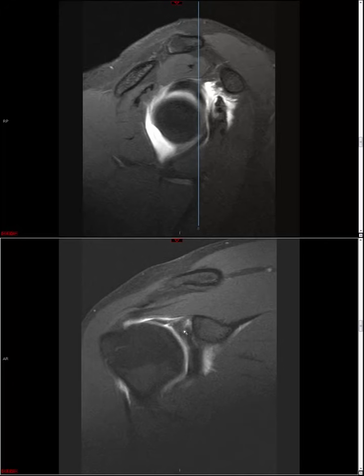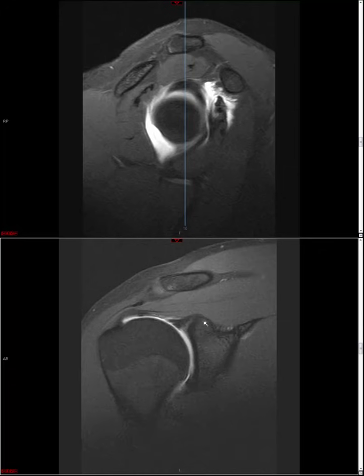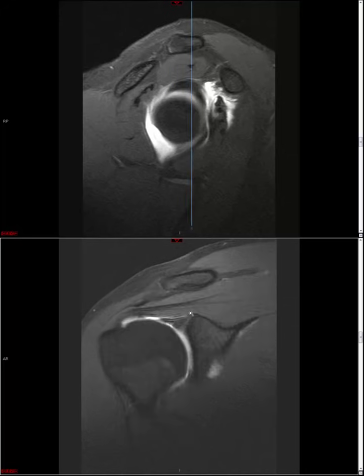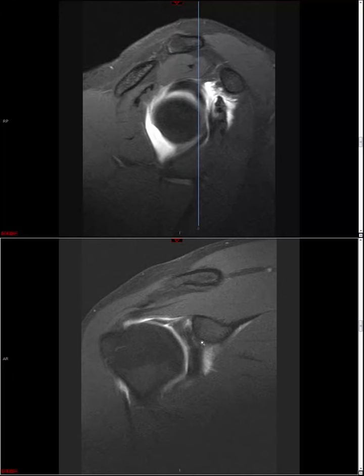Now there's some more recent literature that actually debates whether or not all four of these criteria are 100% reliable. For example, I can recall one paper that talked about how a normal sublabral sulcus can go behind the biceps tendon anchor. But for now, I think just as a general guideline, those are good rules to hang your hat on for distinguishing sublabral sulcus from labral tear. So if you see a labral tear, what you might see is high signal that curves away from the glenoid, or that goes straight up, so that would be good for a tear, or it either changes in thickness as you scroll back and forth, or it's more than 2 millimeters in thickness.